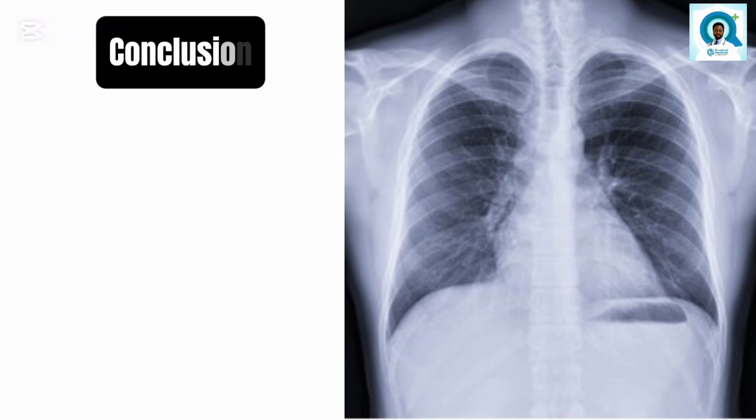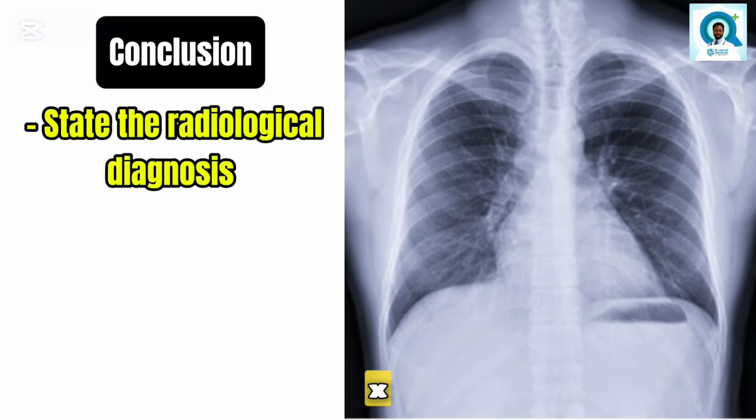In conclusion, this is a normal chest x-ray with no radiological evidence of pathology.